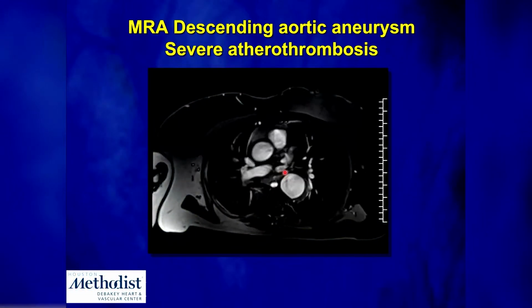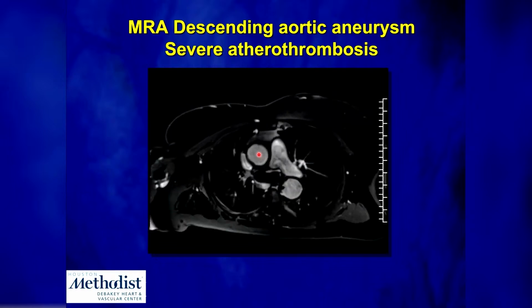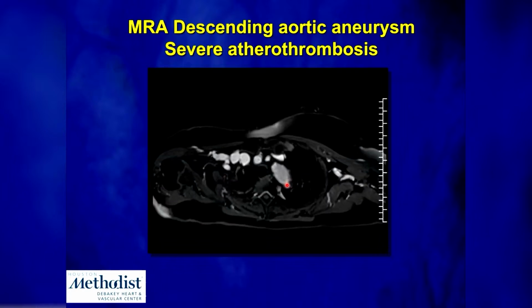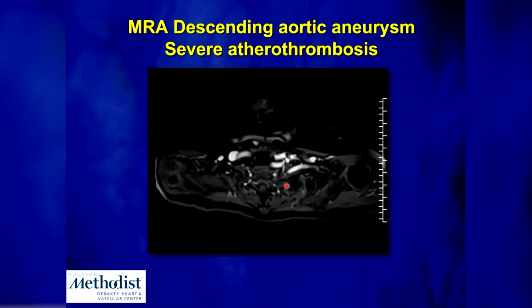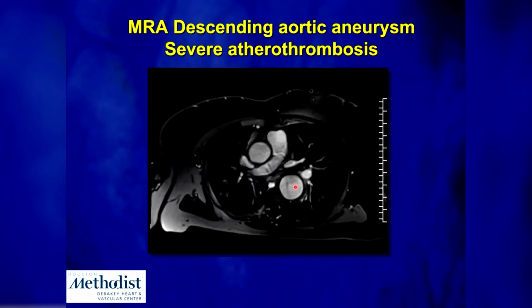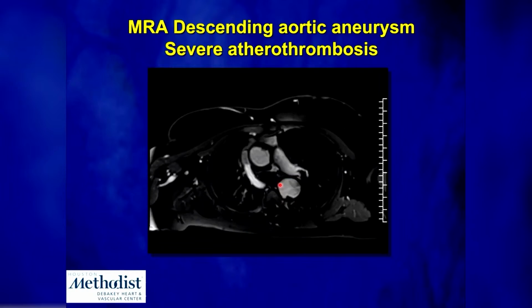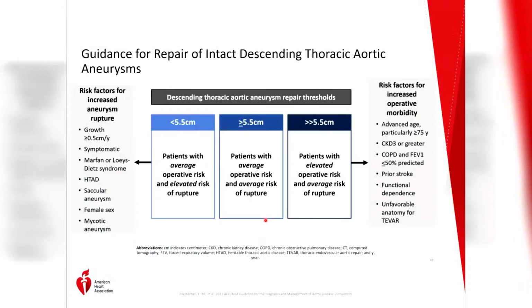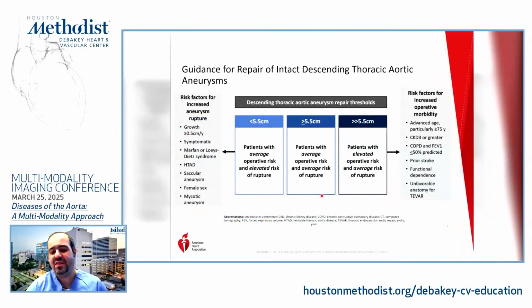Now, this is a magnetic resonance angiography. So this is a 3D acquisition, ascending aorta, descending aorta. And what we are seeing over here is an aneurysmal dilation of the descending thoracic aorta. If you actually go back over here, the size of this descending aorta is large. And number two, there's actually a lot of diffuse atherothrombotic lesions. So these are basically all these protruding plaques. And the way we diagnose a descending thoracic aorta aneurysm is if it hits 4.0 centimeter or above. When are we supposed to repair, or what is the threshold to repair? It's the same threshold as we use for the ascending aorta.